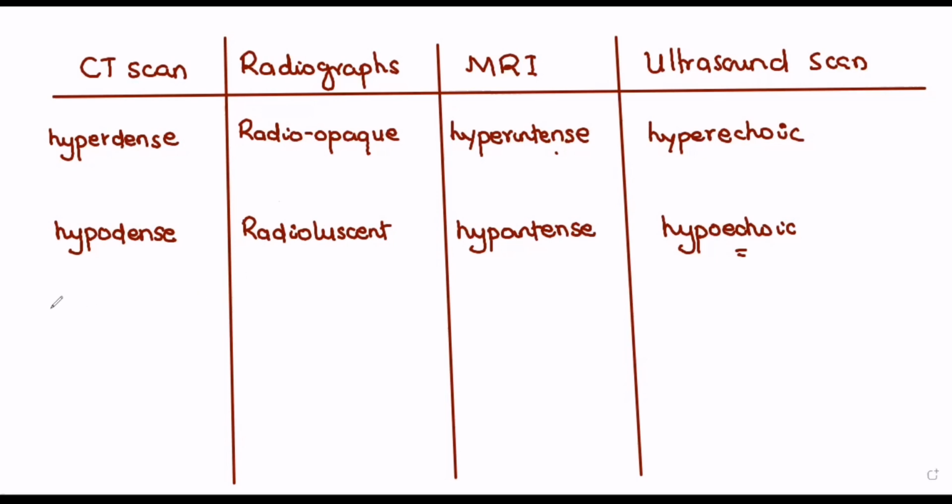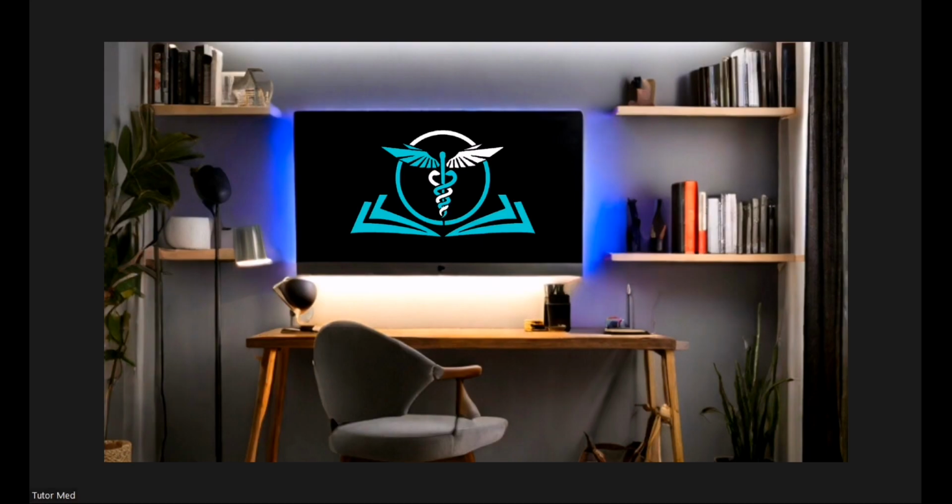So we are going to begin with hemorrhagic strokes, right? Hemorrhagic strokes. So let's look for pictures of hemorrhagic strokes. When you go to the picture station, what would they show to you? Or when you see a patient with hemorrhagic stroke, how would you be able to tell? Let's look for that. Okay, so I have a picture. Thankfully, I have one picture. Good.